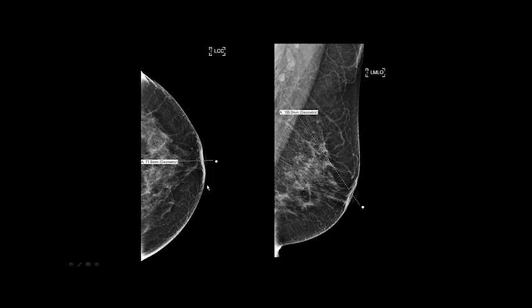So you could see here why this radiologist called the patient back. They just felt that they're missing this retroglandular fat. They are missing posterior tissue because they did the PNL measurement, and that's really nice. The patient got called back. The images were repeated. They were better by a different technologist. So it's a good thing.